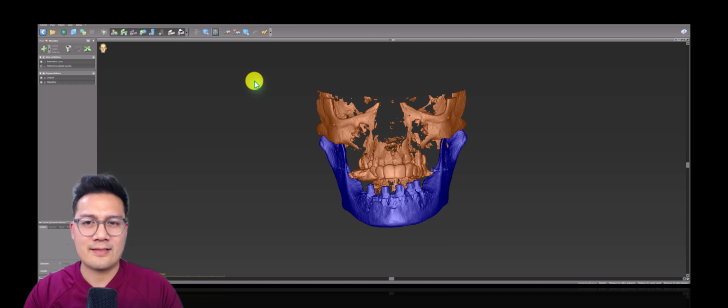I didn't ask what the application was, but there's really only, I think, two applications. One is you're doing a dual scan edentulous case where you scan the patient wearing the denture and you scan the denture separately and you merge those together.